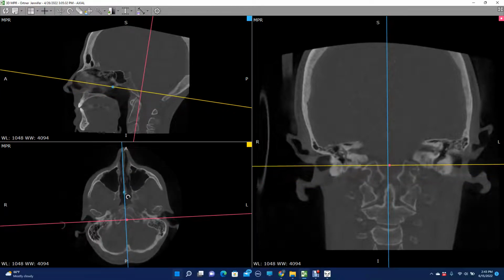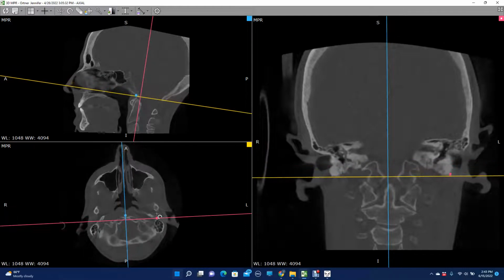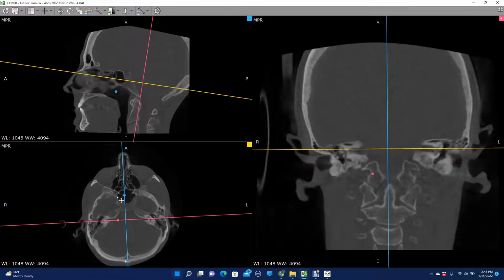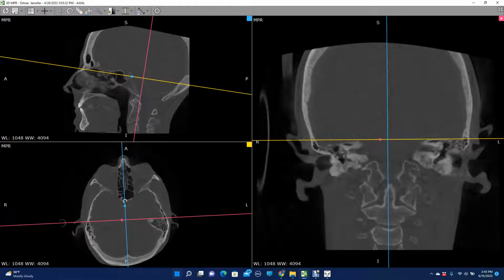And then I can scroll up all the way through the rest of the head. Do the jaws appear together? Those look really symmetrical as I scroll. And so I do more of this qualitative assessment to capture the skull's rotational point and the head tilt point.